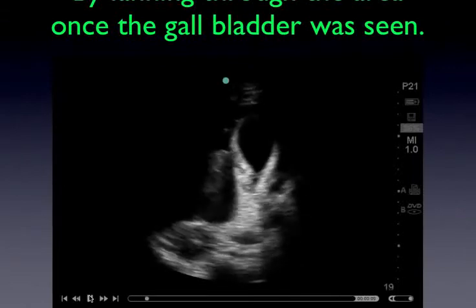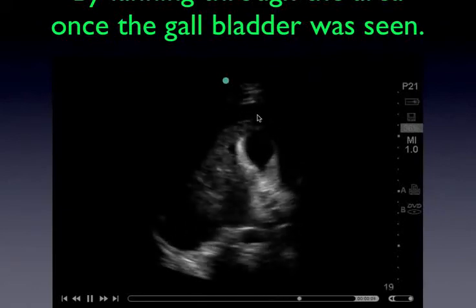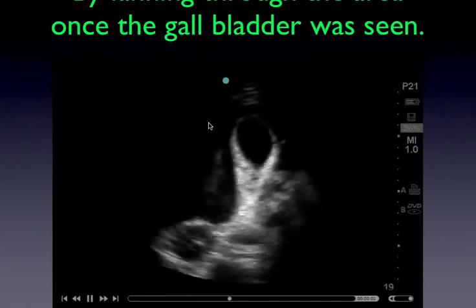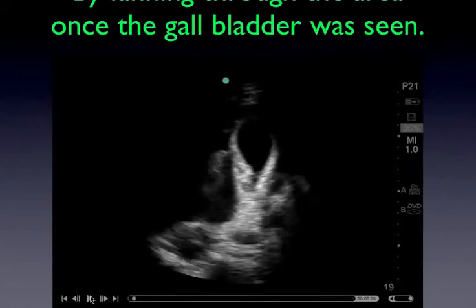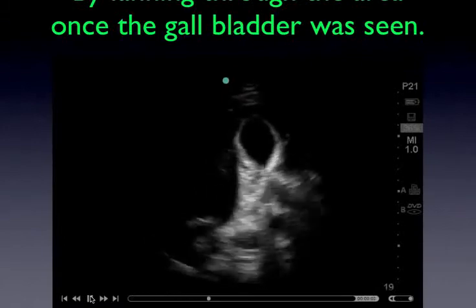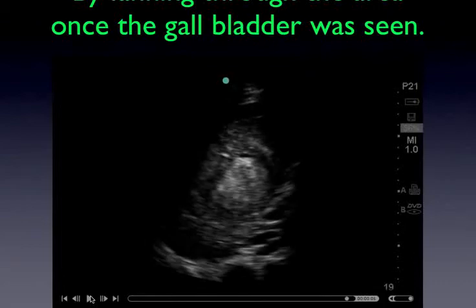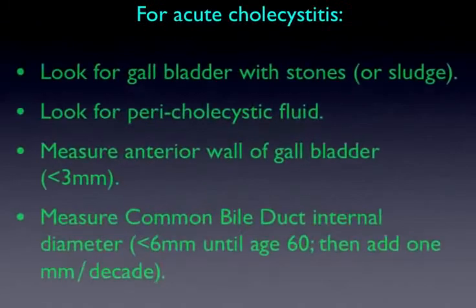There's a reason why this patient has a thickened gallbladder, and that's due to the ascites, which we can see here. And there's a reason why this patient has ascites, and that's not due to his gallbladder disease. That's due to the liver cancer, which was proven by biopsy of this nodule. This mass, actually, not a nodule.